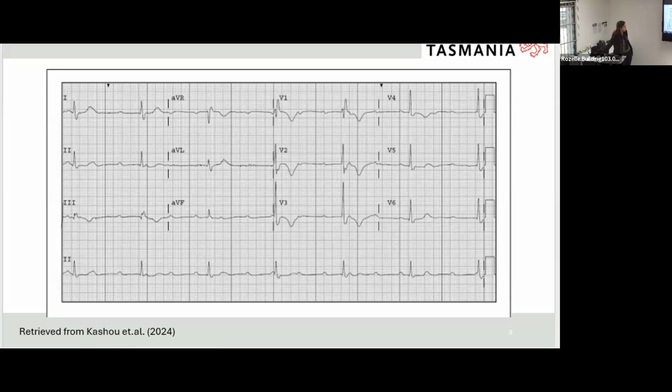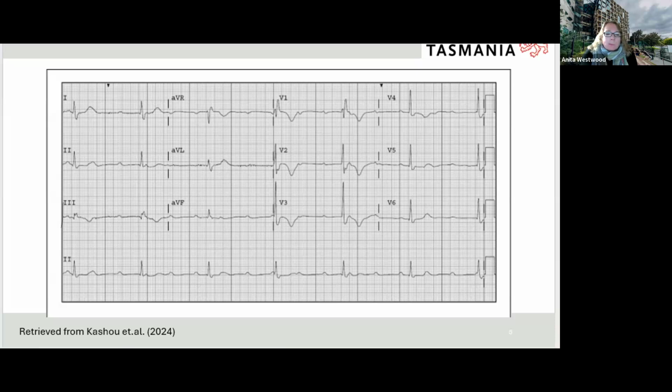Yeah, agreed. But then you have got a pattern for the P waves. If you map those P waves across, they are regular. They occur inside the QRS, don't they? And inside the T waves. But if you map them across, are they regular, or are they in a pattern, do you think, Georgie? I don't think that they are. Okay. No, I don't think that they are.